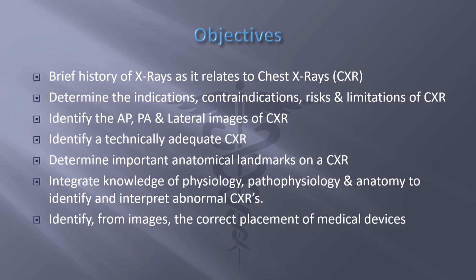We'll look at each x-ray and determine if it was technically a good x-ray, a good or bad technique, and how we can make that determination to get accurate information from our interpretation of the x-ray. We'll use our anatomical knowledge of the chest to find the anatomical landmarks on the x-rays, so that we can determine what's normal and what might be abnormal, and support our diagnoses.